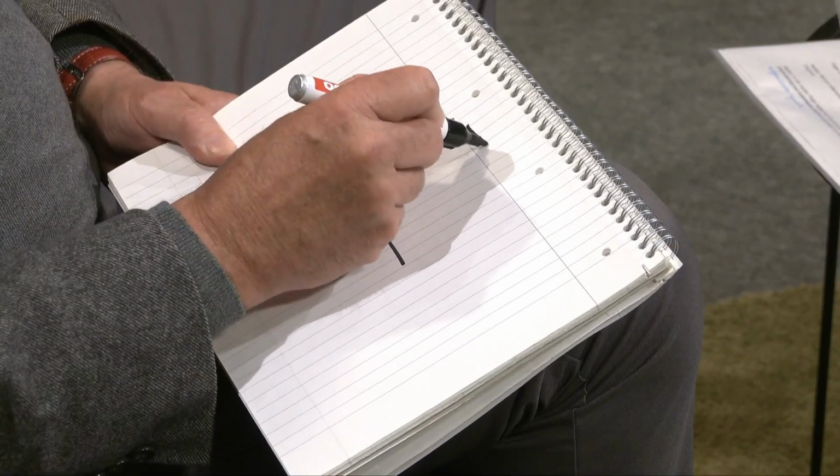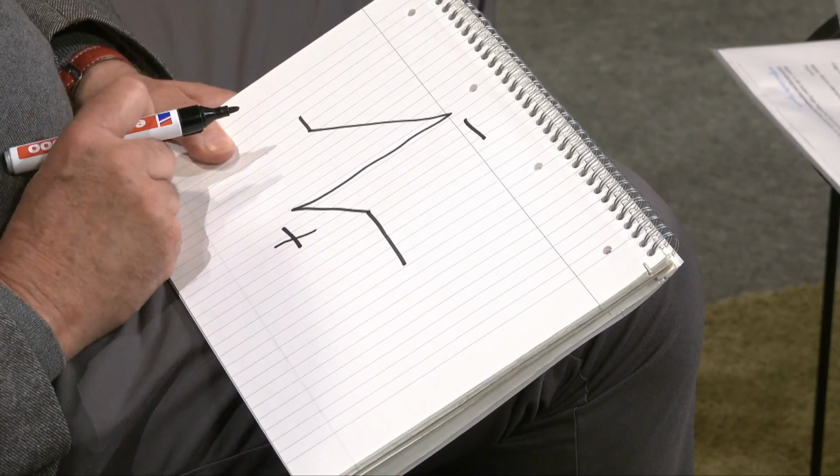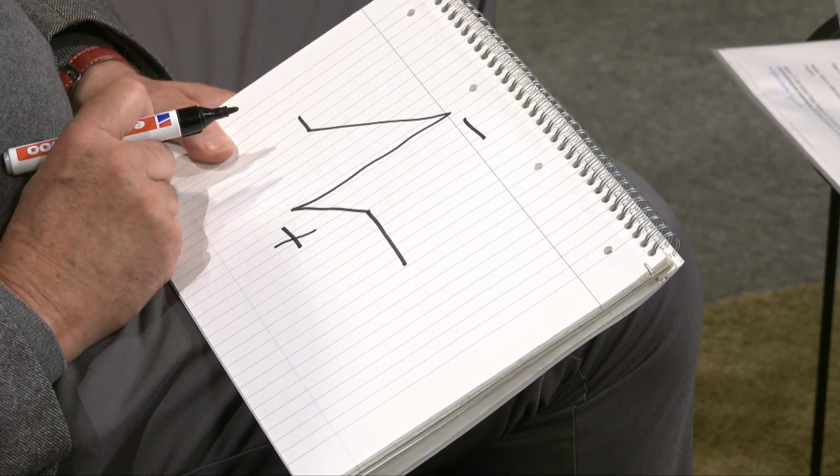And then we have a wonderful, very simple current spike. In principle, you all know this from many movies. For instance, in earthquake disaster films, when the seismograph needle goes back and forth, or in spy thrillers when a lie detector is used. In that case, you're also measuring the electrical current that flows in the brain using electrodes. So how does the current flow?